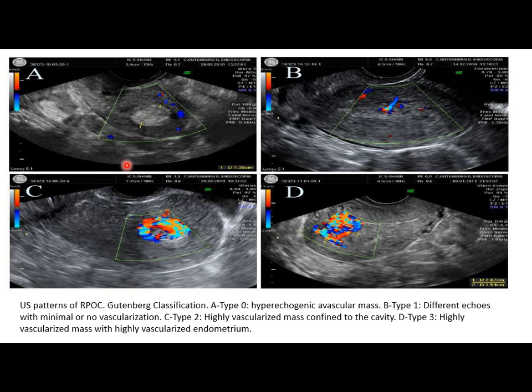So retained products of conception enhance. Now, I discussed that retained pieces of placenta enhance, yes, but the conceptus maybe not. When we talk about retained products of conception, we're talking about the placenta, maybe.